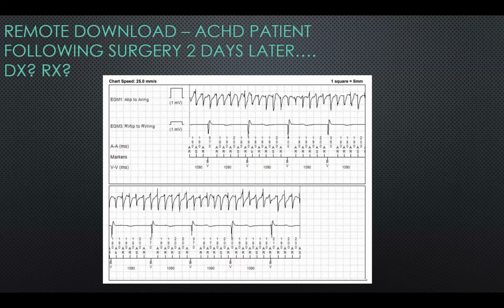Okay, so you're going to tell them to stay home, come in. What do you want to do with this patient? I will ask them to come in. Okay, so they come in and you interrogate the device, and in fact, this is what you see. Same thing that you're looking at.